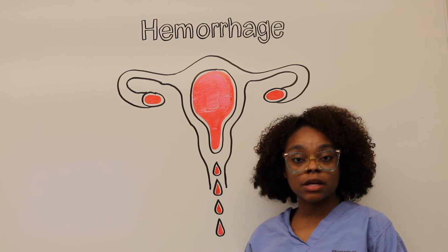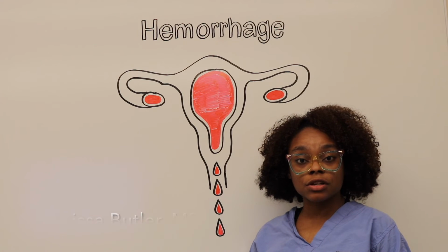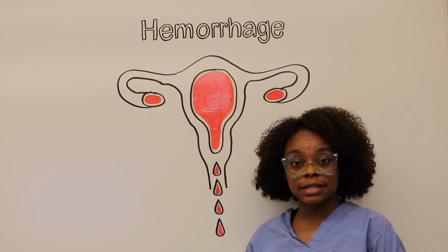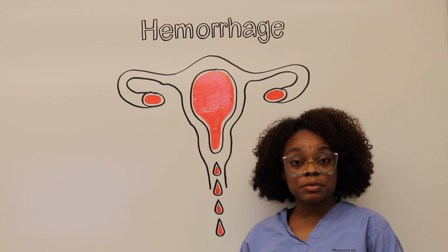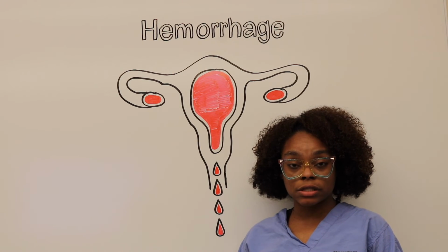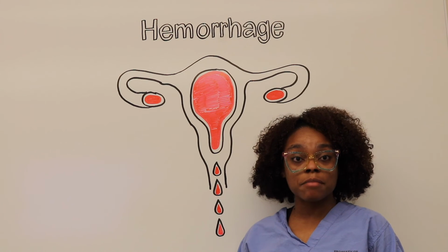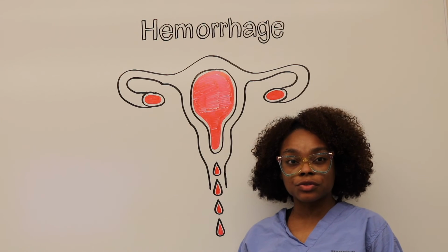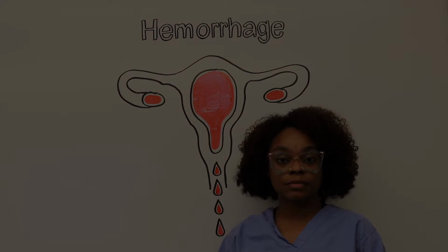Clinically significant bleeding or hemorrhage can occur during hysteroscopy. Risk factors include cervical laceration, uterine perforation, adhesiolysis, and resection of cavitary lesions. Management options include applying electrosurgical coagulation to visible lesions, injecting intracervical dilute vasopressin, administering tranexamic acid, using a Foley catheter balloon for cervical tamponade, and manual uterine compression.